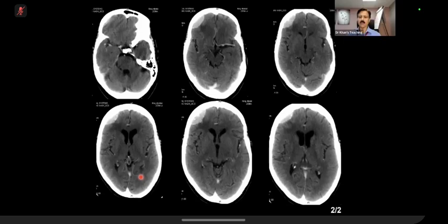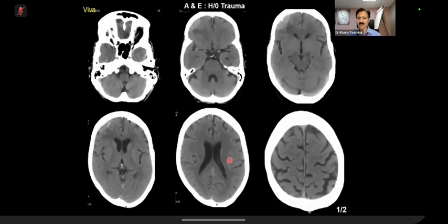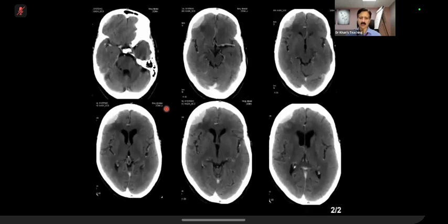Have you noticed that I've shown you the next meningioma, maybe an elliptical kind of meningioma? This is a meningioma. That was a trick case. It's a trick case which can come in the exam. This is a classical trick case where you assume things. And by the way, this is what happened in this case. This presented with a history of trauma. And the key thing is that this is a meningioma with calcifications. You start thinking, why calcification? Give contrast, and this is a meningioma.